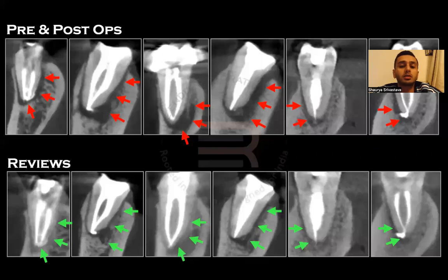Now, why does this formation of a J-shaped lesion happen, especially in mandibular teeth? It's because when you have periapical inflammation or healing, or a lesion, these lesions need to find the least path of resistance for draining. So if you let lesions be long-standing in your mandible especially, they will start looking like J-shaped lesions on your 2D radiographs.